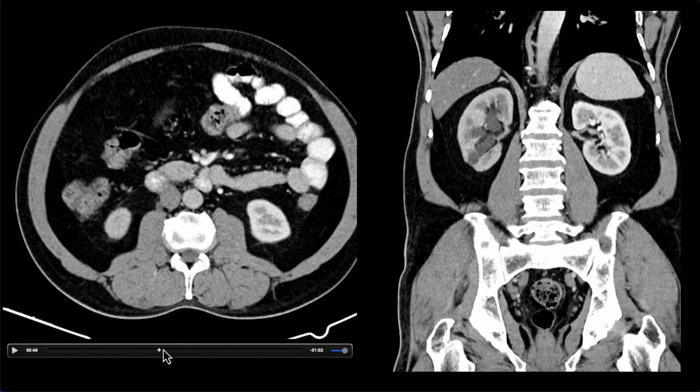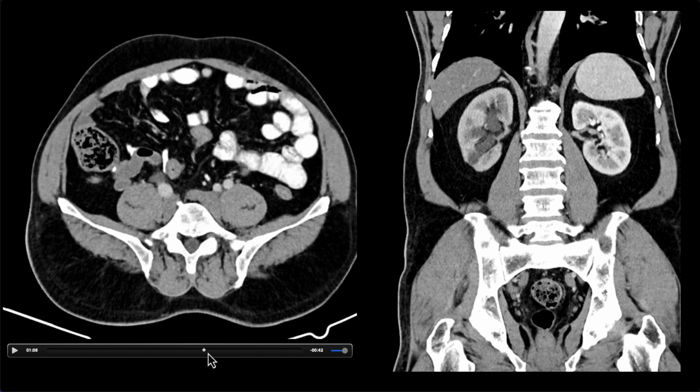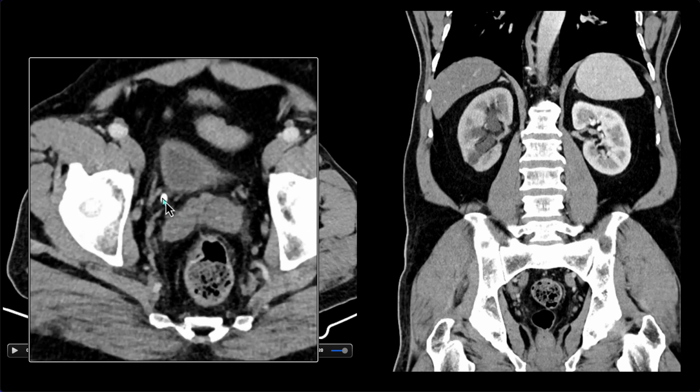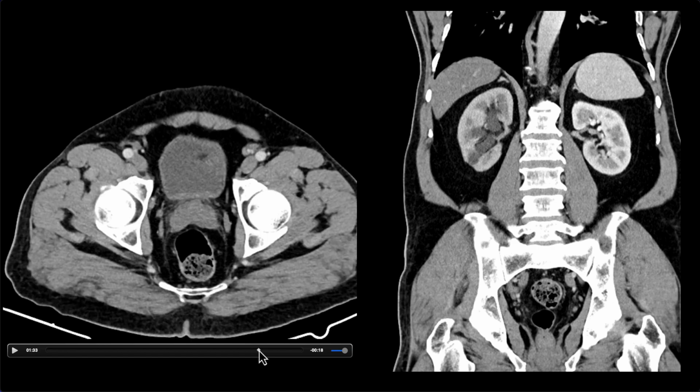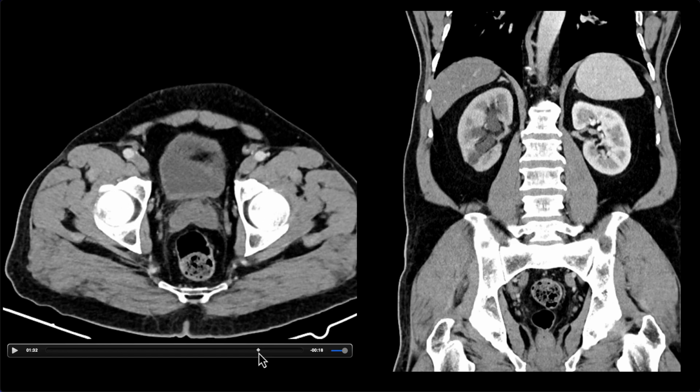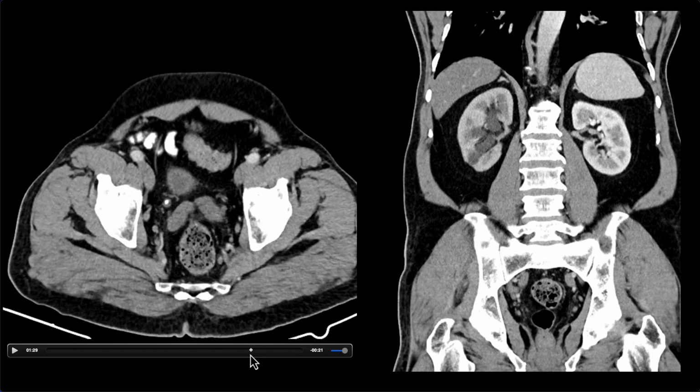running that whole ureter. And so let's follow that right ureter all the way down to the urinary bladder here, and we find this stone just 1 or 2 centimeters above the ureterovesical junction here, just before it starts to pass right into the urinary bladder. So here we go, distal obstructive stone resulting in hydronephrosis and delayed nephrogram.